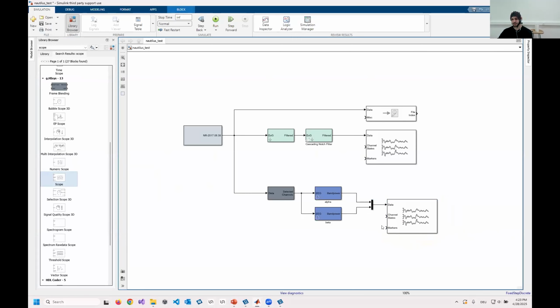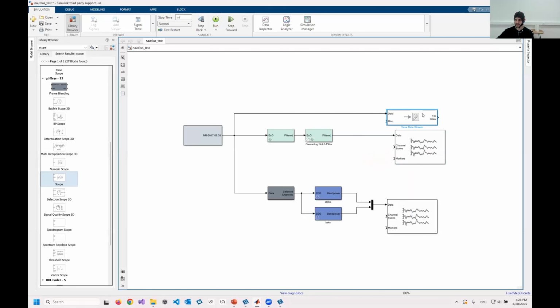So now, whenever I'm closing my eyes, the levels of the first 8 channels should change, while the level of the other 8 channels should remain similar. So I'm going to test that again.